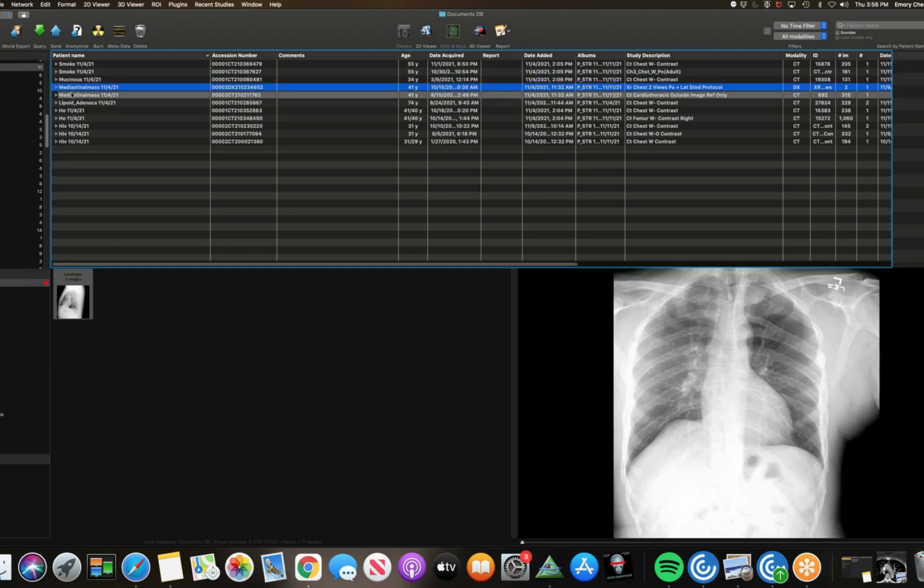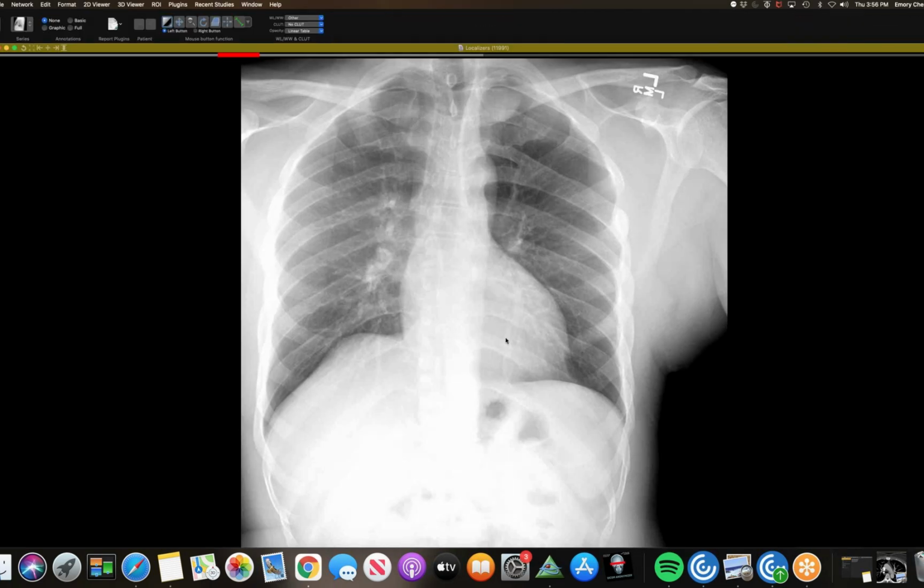And then one more quick one. And I think we froze for a second. So in a way, that's another case of fat associated with adenocarcinoma, like your first case, or your third case? So that one was adenocarcinoma that leaves behind fat. And then this last one I forgot to mention is a mucinous adenocarcinoma, the most recent one that I just showed. This one is an eye test.